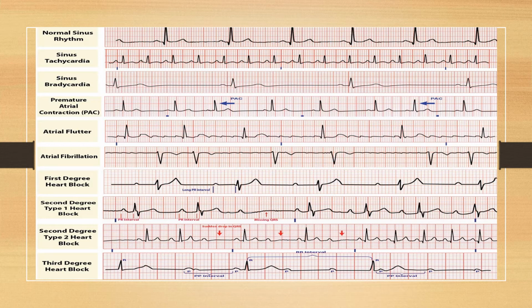So the underlying rhythm is normal sinus rhythm, and every once in a while, the atrium is sending off a premature atrial complex. And that's why it's arriving a bit early. And if you were to feel this person's pulse, it would feel a bit irregular because those premature atrial complexes are coming a bit early. Totally harmless, nothing to do. Maybe tell them to stay up. Just diminish coffee and any stimulants.